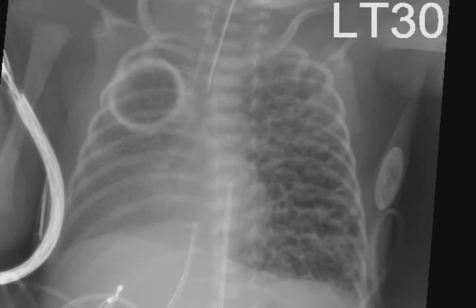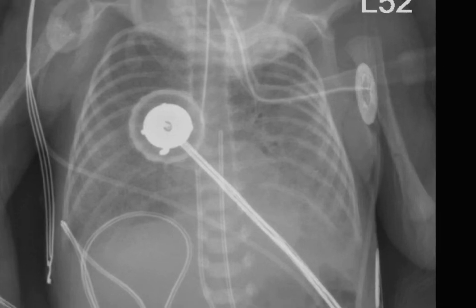There's a different patient with the same problem on the left side. There's diffuse tension interstitial emphysema involving the left upper and left lower lobes with mediastinal shift to the right. Although unusual, this is the exact same patient I just showed you. This is an x-ray done the very next day, and you can see that all of the interstitial emphysema that was present throughout the left lung is completely resolved, and it resolved without the development of a pneumothorax or a pneumomediastinum. It's unusual, but it can happen.